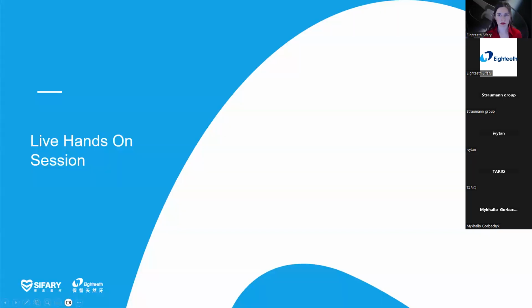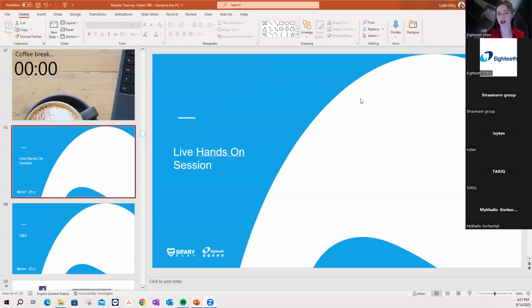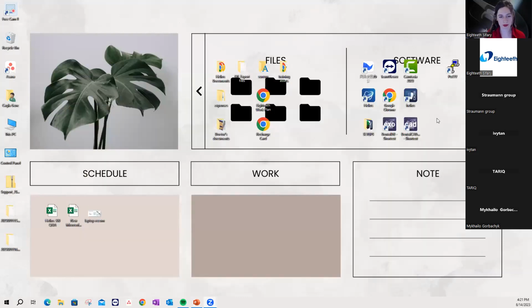Okay. Hope everybody came back. So now I'm going to start presenting and start working with Helios. After clicking the software, the double click. Just a second, I'm waiting for an answer from my computer.